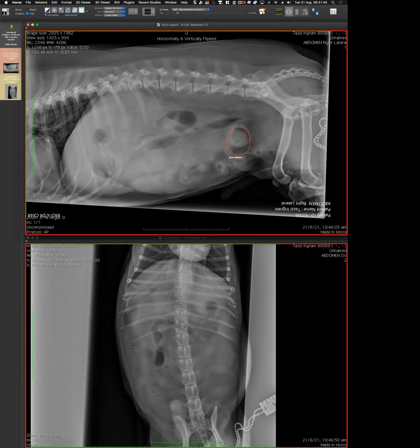Definitely here, and possibly anything in this area which has a reduced detail. And this here could be large intestine that's just pushed a little bit more cranial than normal. And it's not at all connected to this here. So it may well be that that's just large bowel and this is small bowel.